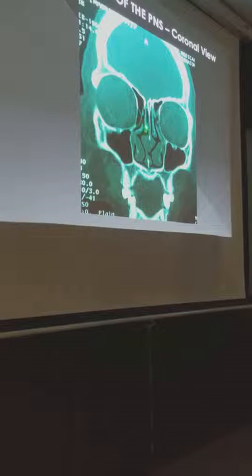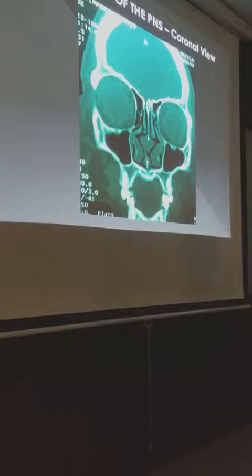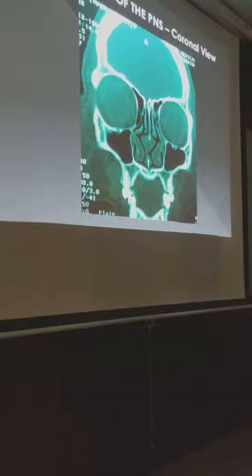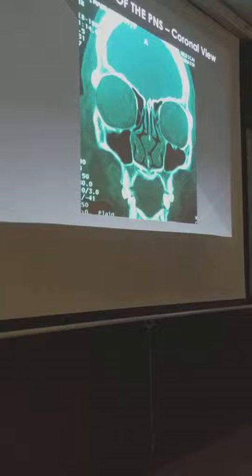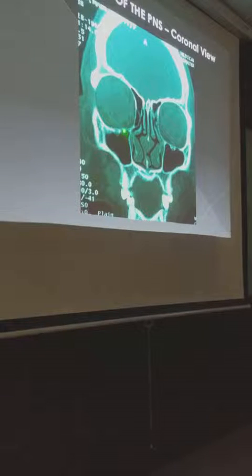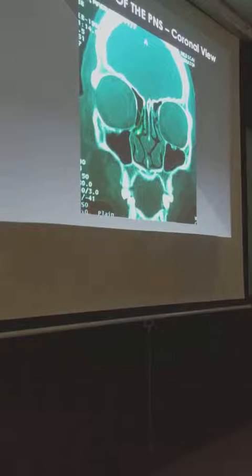Ito yung uncinate process mo. Now, the uncinate process has a variable attachment superiorly. Importante yan. Yung superior attachment, pinakita ba sa inyo ni Dr. Matubis, where it can be attached? It can be attached directly into the skull base. It can be attached to the lateral surface of your middle turbinate, or it can be attached directly into your lamina papyracea. Yun yung superior attachment. The antero-superior attachment of your uncinate is variable. Pinakita ba yun ni Jake? Okay? Na pwedeng umakyat doon, pwede dito, pwede diretso doon.